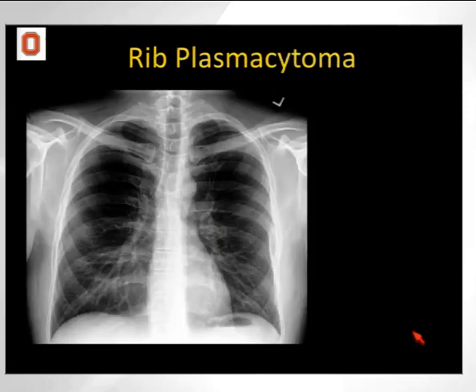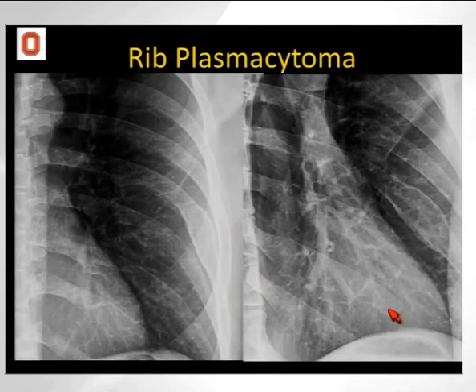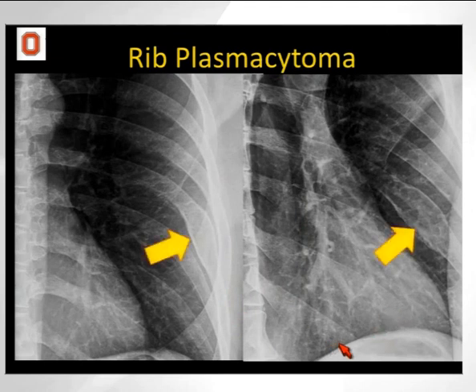And then another one, if you just rotate this patient just a little bit, you can see how this abnormality could hide underneath the inferior angle of the scapula. So in this one, you have to be a little bit lucky. We biopsied this one, and this was plasmacytoma. So always remember that regardless of the age, you always have to consider the possibility of metastatic disease.